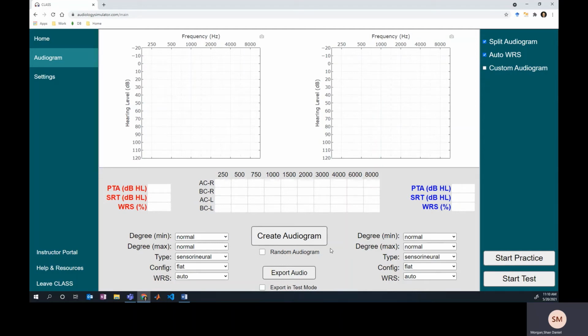This video is part of the Audiogram of the Day series where I complete a new random audiogram using the class simulator and post it for you all to watch.